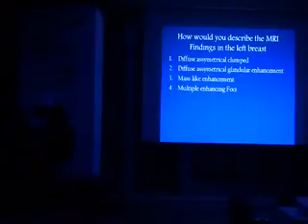One would ask, come on, what's really the importance? It's just the enhancement. No, the pattern of enhancement would put in your mind what's the differential diagnosis that we're looking for. So, let's go for number 1. Diffuse asymmetrical clumps. Diffuse? It is diffuse, involving more than one area of the breast. Asymmetrical? Yes, it is asymmetrical. We all agree about that. Clumps? Yes, they are clumped together, but spread over a diffuse area.